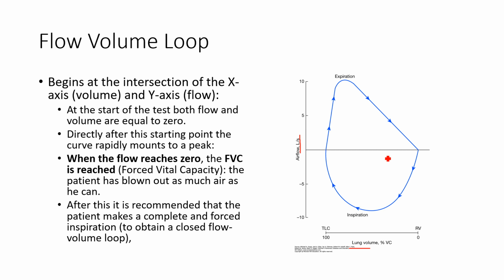The test involves 2 cycles. The patient starts ideally at residual volume, so the air is completely removed from their lung, and they take a deep breath in, fully breathing in. The top part of the y-axis, or the positive side, is expiration, and the bottom is the inspiratory maneuver. Remember, there are both parts to the test. Sometimes some devices only measure the expiratory component, but typically you measure a bit of both. And I'll show you why in a second.